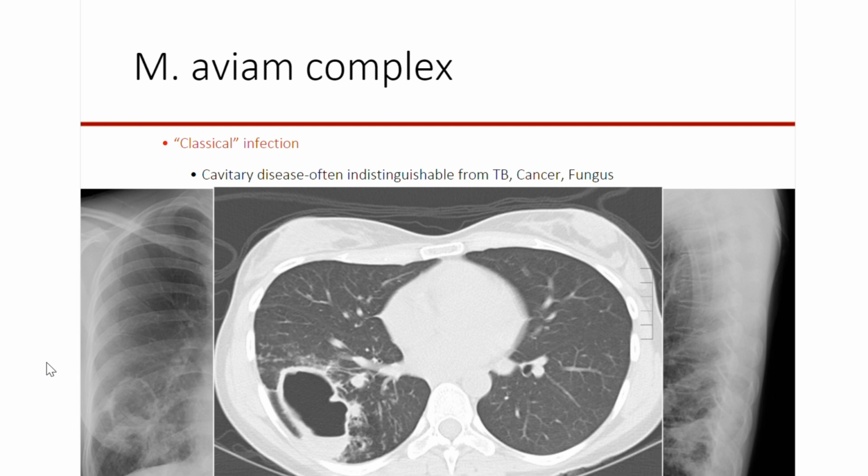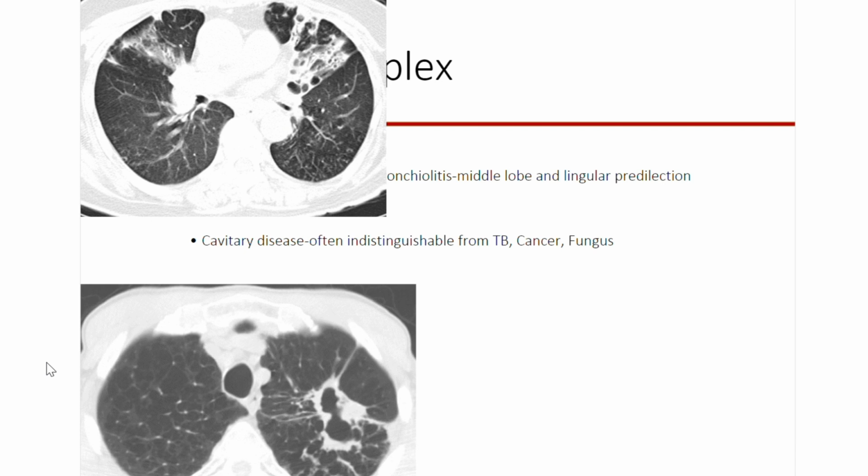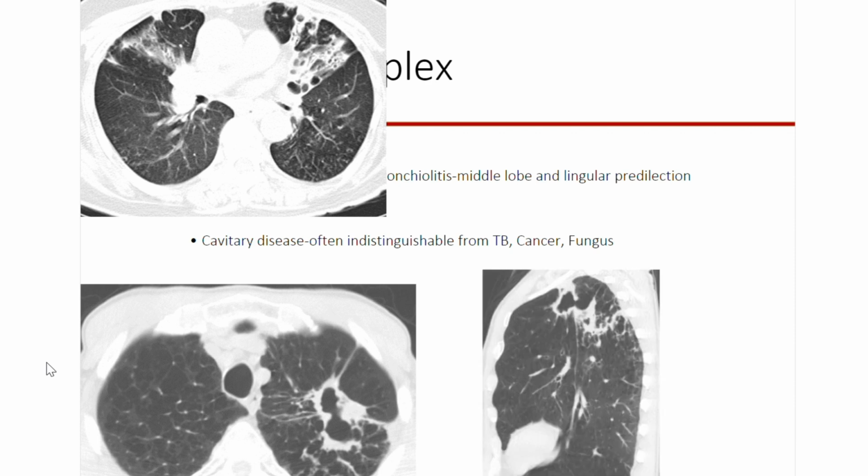Imagine when they're 80 and they have emphysema, and they have lymphadenopathy, and then we're going to be really going crazy trying to make the diagnosis. Such as this patient here, everyone can see the emphysema. We have a process that goes through fissures. We all know that fissures are meant to contain infection. And if something goes through the fissures, we're supposed to think of bad bugs: tuberculosis, mycobacterium, fungi, and cancer. So you better believe that I dictated this as likely a cancer.